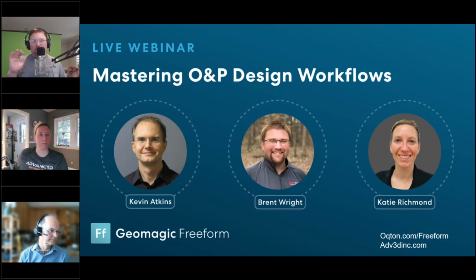This is where you can really dive in the deep end, but there is something called a buck, which means that you keep the voxel, everything and anything that you do as an addition to the buck itself. So what I would probably do in this case is smooth where I wanted smooth, change it to a buck. I wouldn't do a global smooth yet.